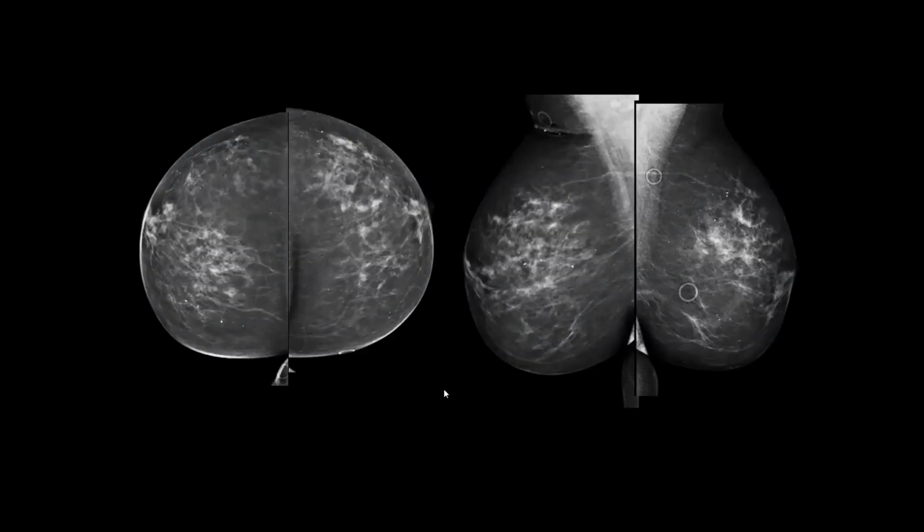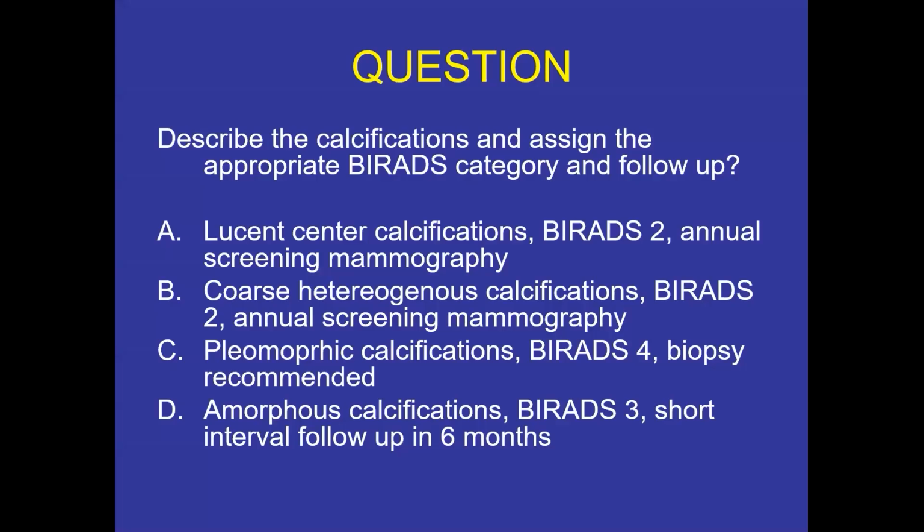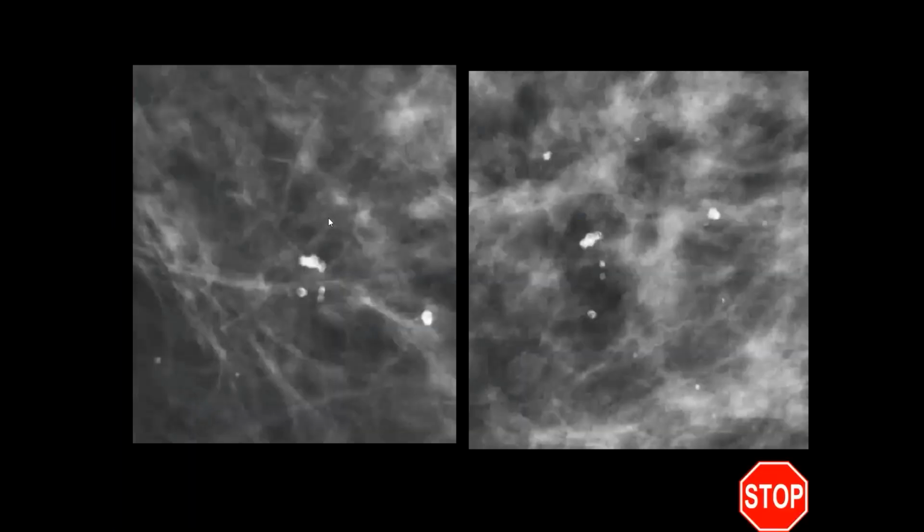Let's do our last case, another screening, just to keep on the theme. And now I'll just go to mag views because we love mag views here. Okay, and let's do the question, and I'll scroll back once the question shows up to that last image so you guys can look at it. Okay, and let me move this off to the side a bit. Hopefully you can get a good view with it there.